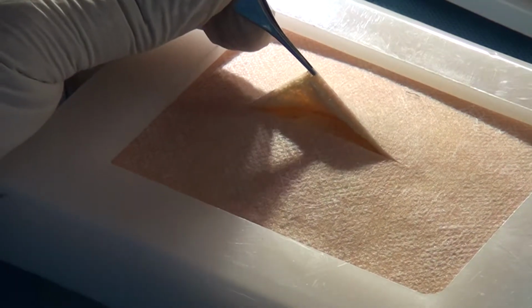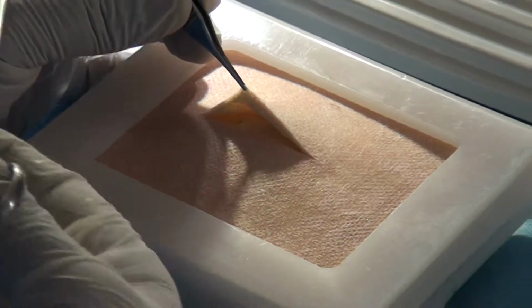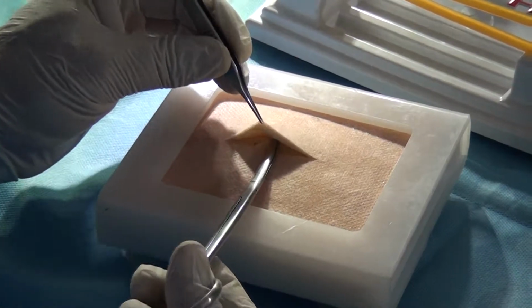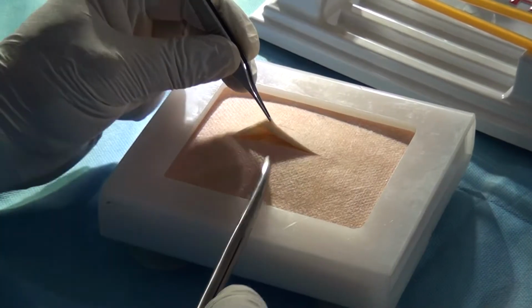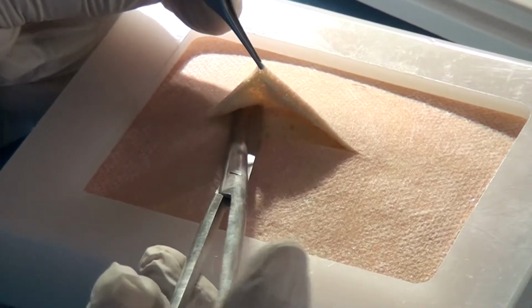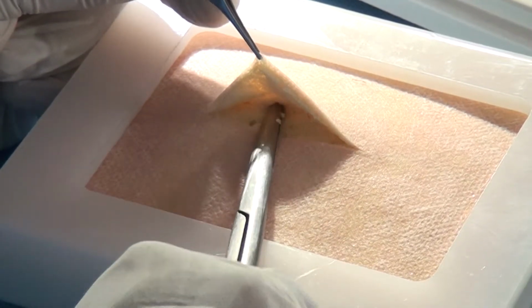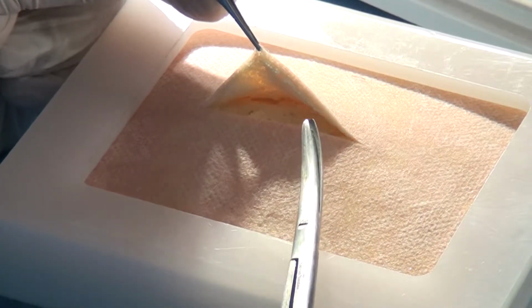So this is the instrument, and I'll show you how I use scissors for the purpose. Now I'm putting it against the light so that you can see the light is here. Light has to come from there only. Now can you see or you can't? If you can't, you must tell me so that I can adjust. That's better. Now with the tip up, I make a cut, and with the tip down, I spread it. So it is a dissecting scissors.